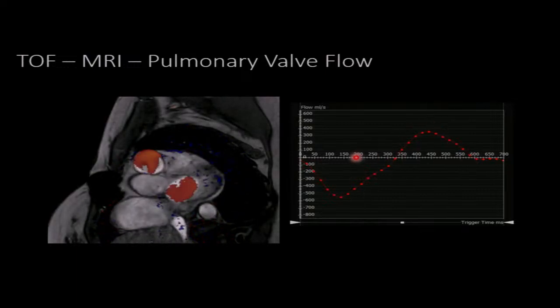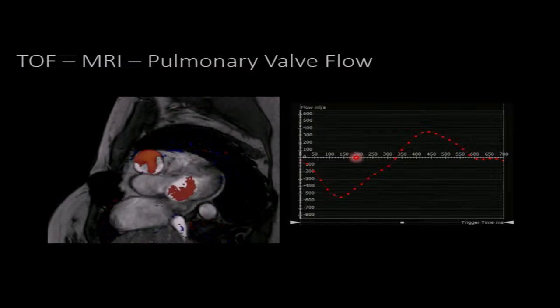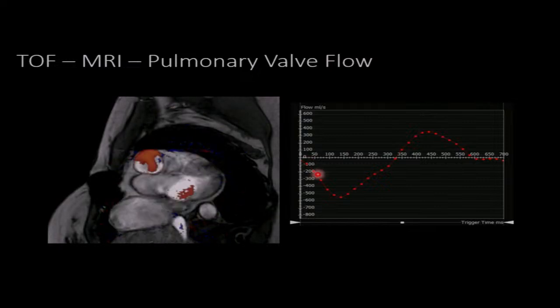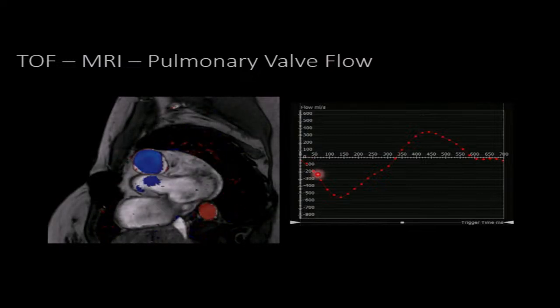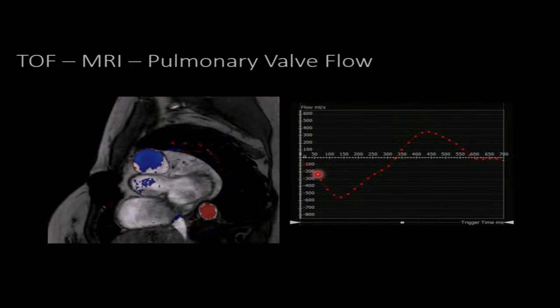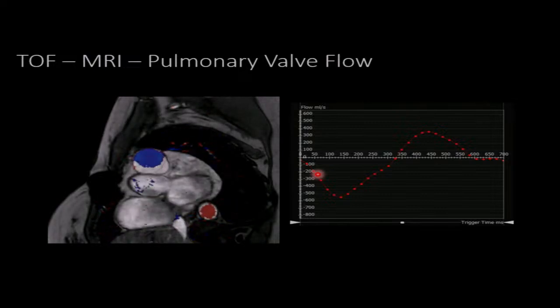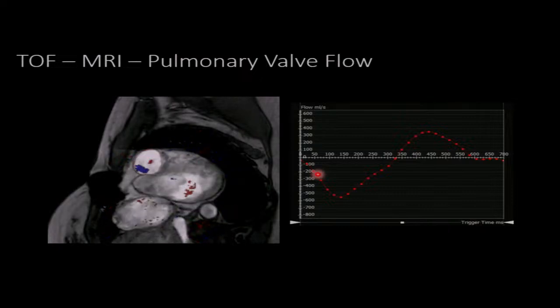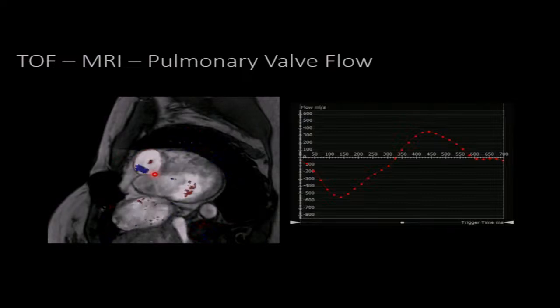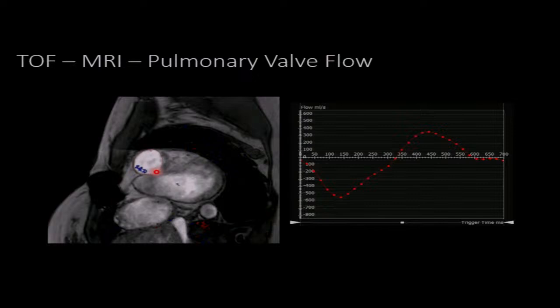In general, just like you see in the aorta, you should see just pulsatile forward flow. Is that the case here? Yeah, very similar to the echo pattern that we were looking at. Think about the continuous wave across the pulmonary valve that goes down below the baseline, and then everything that's regurgitating is going to be above the baseline. So this patient, you can see that in the color too, right? You see blue and red.